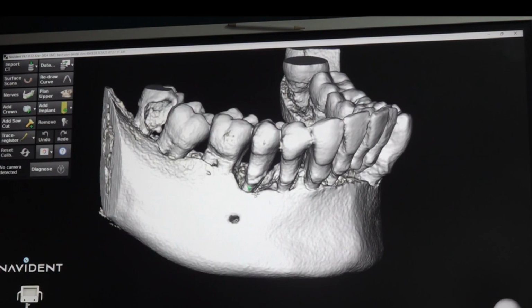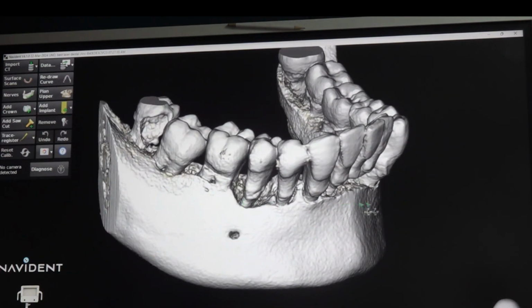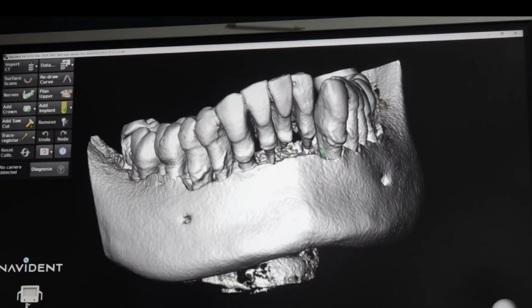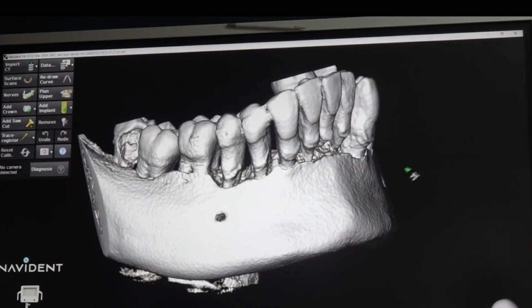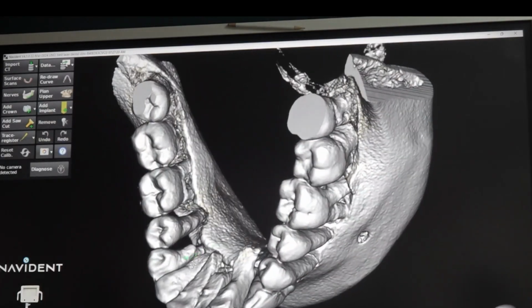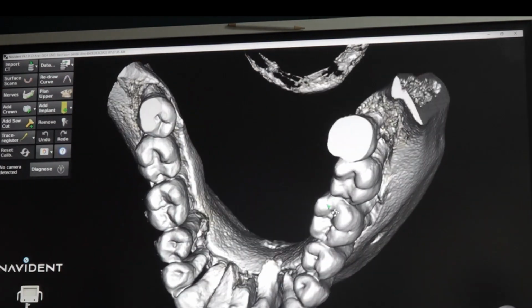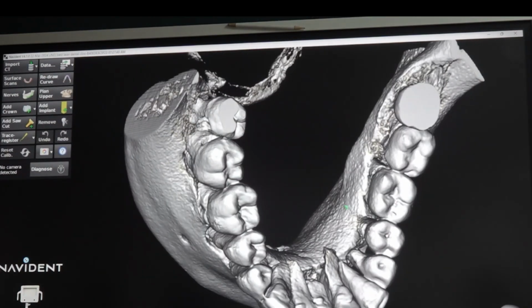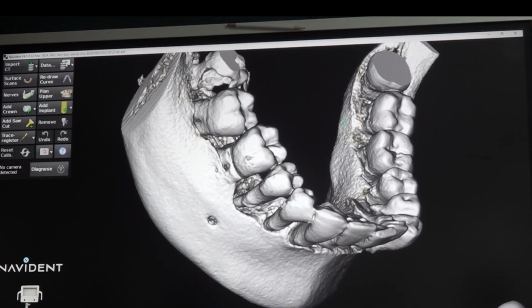You can see the severity of bone loss here. It looks as though a good alveoplasty has already been done by the disease, except maybe in the 6. So alveoplasty we may not have to do much, just leveling is enough. In 5 there is bone loss on the lingual side also. Basically the lingual cortical plate will be very thick. It won't resorb that much. If it resorbs, that means the disease has been standing for a long time or is very aggressive.